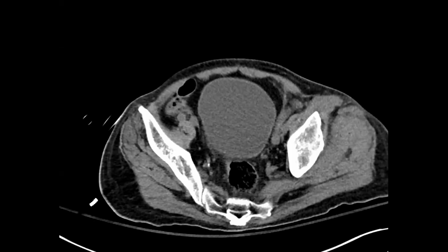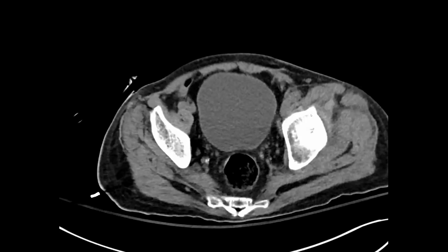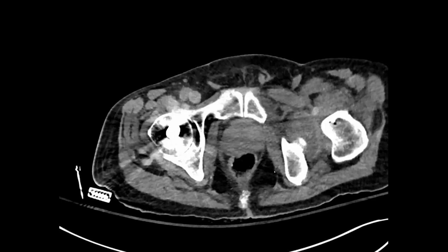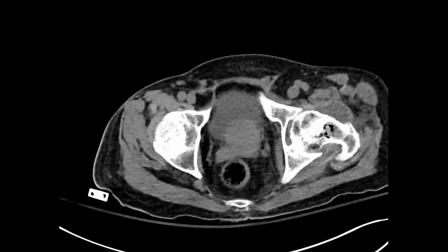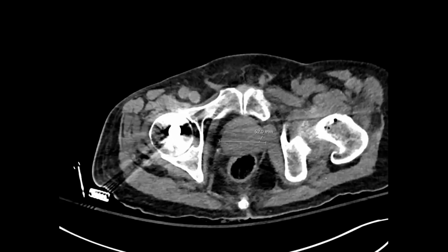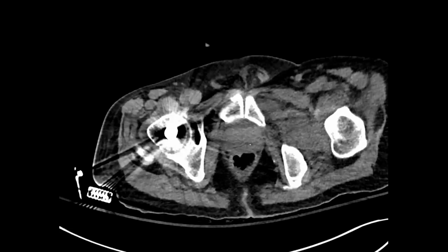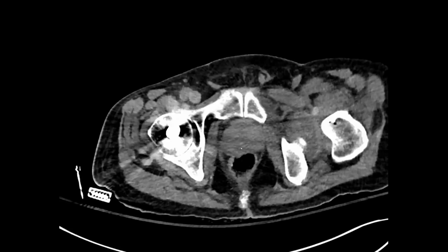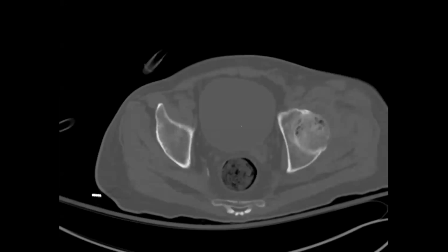Okay, this is for, you guys do not do musculoskeletal, right? Over at Arkansas. So this is an MSK case. Our fellow is here. She does a lot of MSK. I don't do much MSK, but she's here. Okay, so don't focus on this mildly enlarged prostate. Focus on the musculoskeletal structures. I'll put it on bone windows.